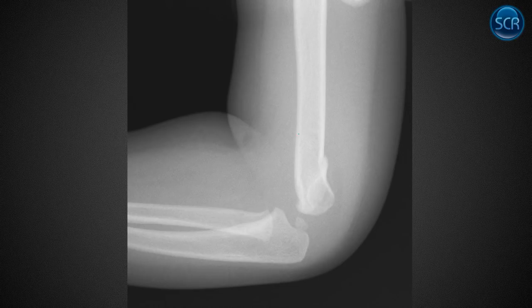But the way you can more objectively assess for that, because oftentimes you can't see the fracture or anything suggesting it, is the anterior humeral line. So you draw a line down the anterior humerus. It should intersect the central third of the capitellum. Right? So if I draw the capitellum here, the anterior humeral line is completely anterior, and that's because this thing has bent backwards and brought it out of that line.